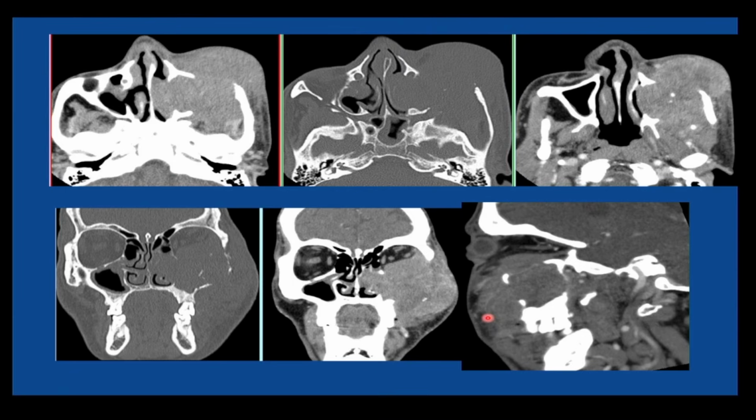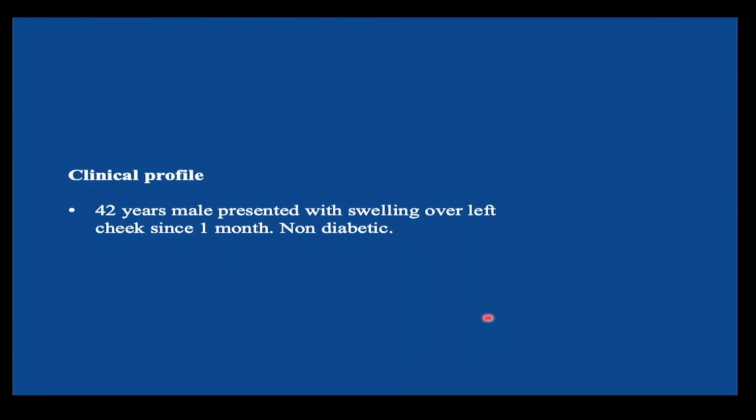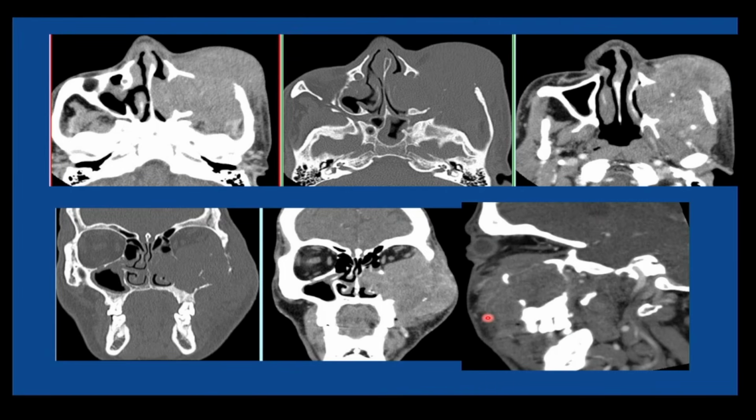Okay. This is multi-compartmental. The lesion is so aggressive, and only one month, so aggressive that it is eating up all the bones and going everywhere. If you are in a center where this CT scan was done and they have not done contrast, don't ask for contrast. Go ahead and do an MR, because in my mind, I'm thinking this is a tumor.